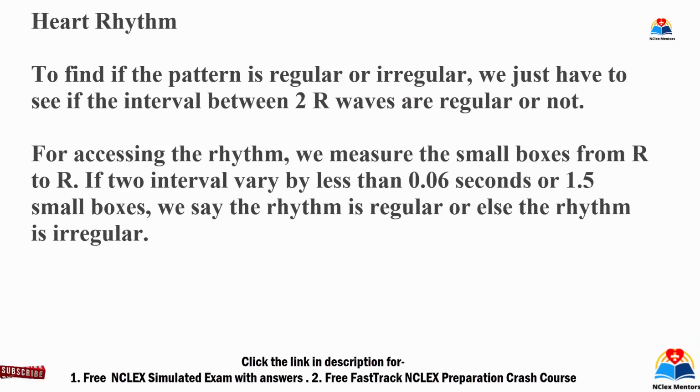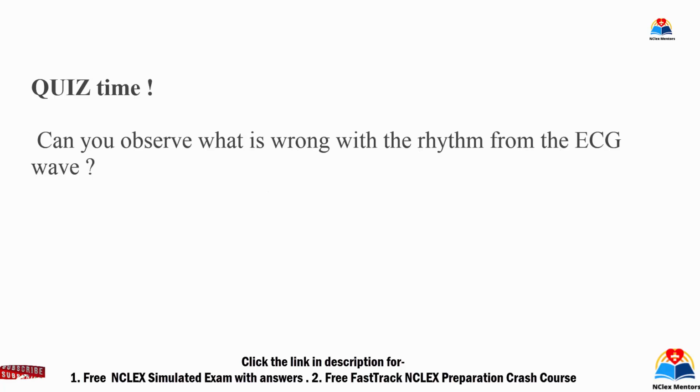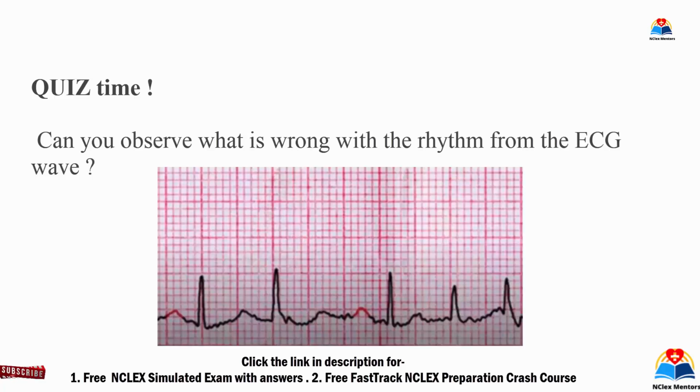Generally, in exam conditions, you won't be asked to count the boxes, but may be asked if you know how to determine regular rhythm or not. Quiz time. Can you observe what is wrong with the rhythm from the ECG wave? Yes, you are right. The spaces between the R waves vary. The rhythm is irregular.